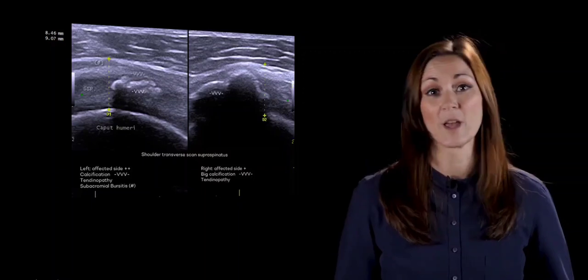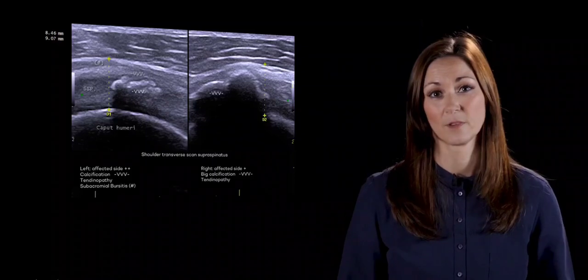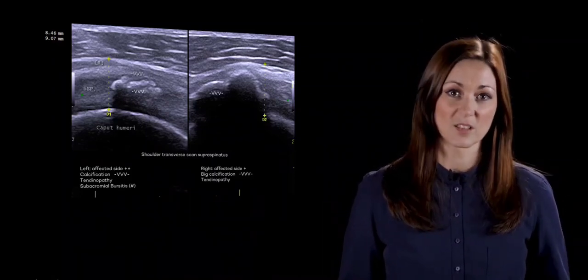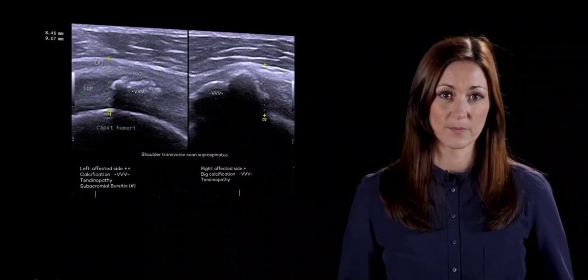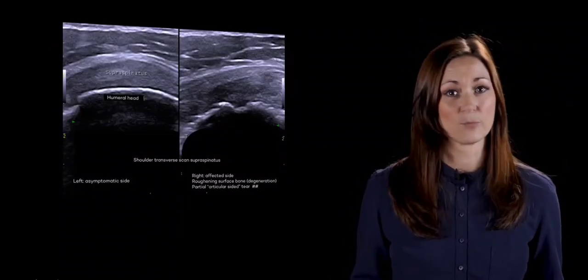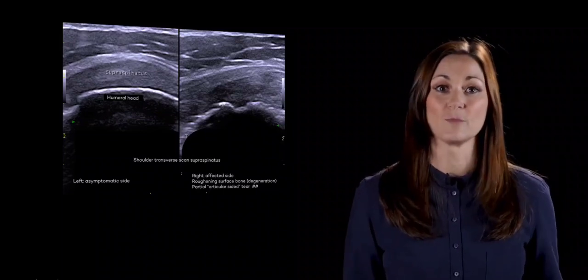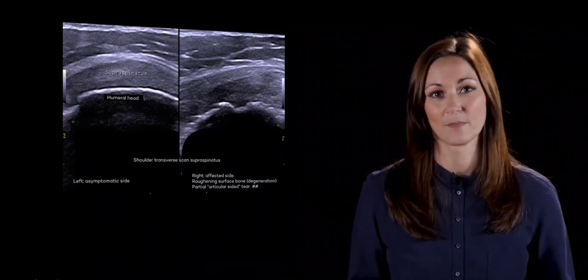This patient had a lot of pain on both sides, left more than right. Big intratendinous calcifications can be seen. Of course, these calcifications are not the only cause of pain, but they certainly interfere with the treatment. Patients will ask you, how long will it take for the problem to heal? How sure are you about your answer? Maybe you rely on the connective tissue repair phases, but then you presume that the complaint can heal totally.